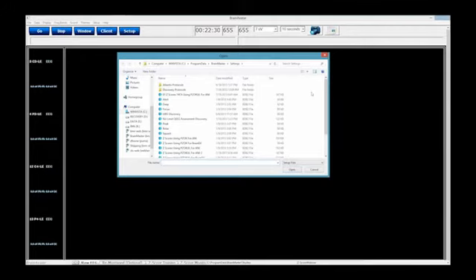One of the things that you're going to notice that's a little different in the BrainAvatar 4.4.1 software is that you probably have 2 new file folders when you go to import a setting file that weren't there before. There are ones called Atlantis protocols, and ones called Discovery protocols. You're also going to notice that you probably have a whole bunch of them right out here outside the software as well. Either way you can load which protocols you want. I recommend using the ones inside the file folders.